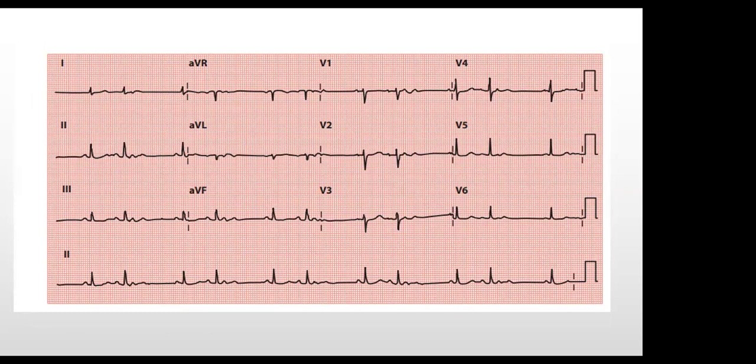So when you're in doubt, just check this new one. Let's say the third beat in this rhythm, compare it to the second beat. You're talking of this one? Yes. So that's the easiest way to go about it.